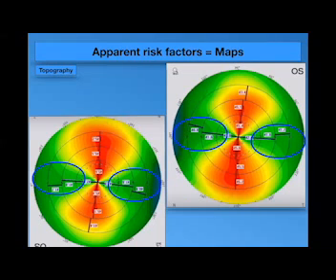But you may call it superior ectasia, with a thinning factor which may cause thinning of the superior part with protrusion of the superior cornea, but not keratoconus. There is no superior keratoconus, and I respect all the authors and professors who say there is what's called inverted keratoconus, but about myself, I don't believe in it.